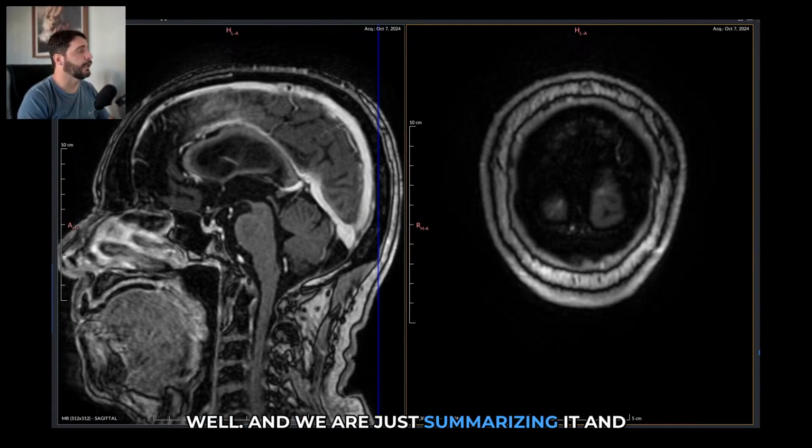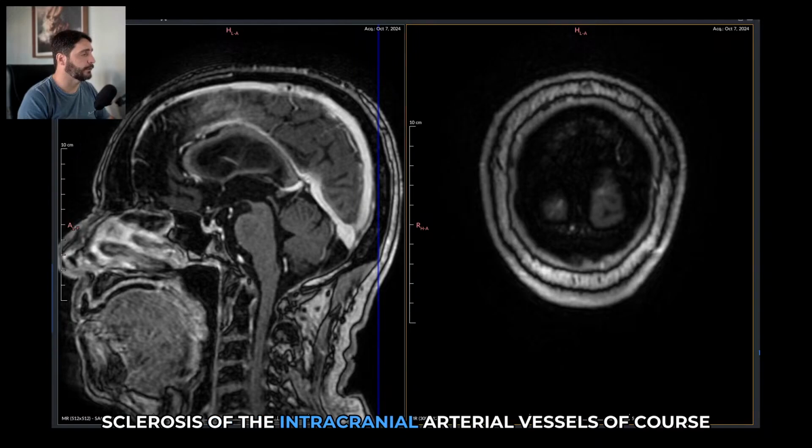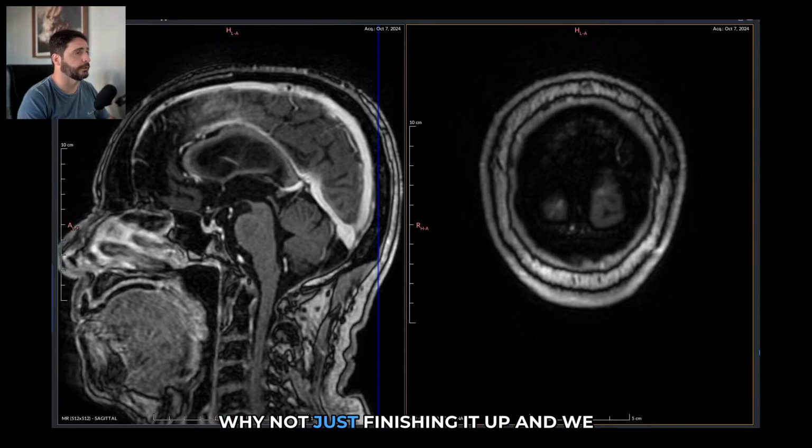And we are just summarizing it. And we are going to be done: arteriosclerosis of the intracranial arterial vessels. Of course, why not? Just finishing it up. And we are done.